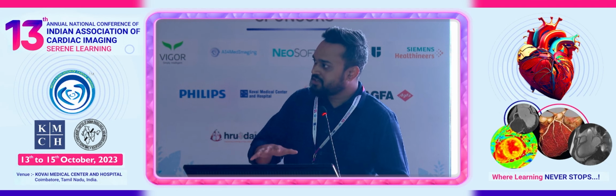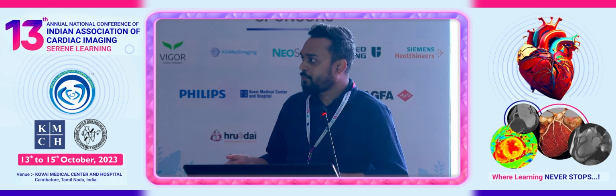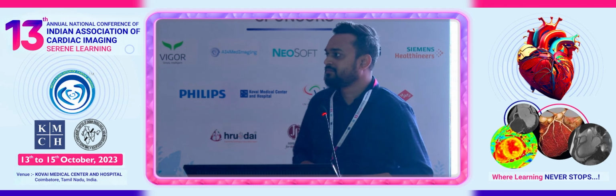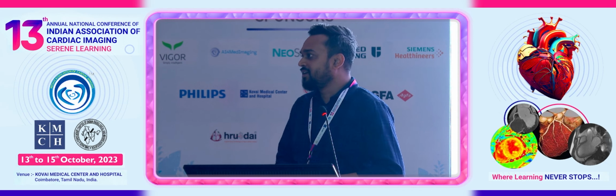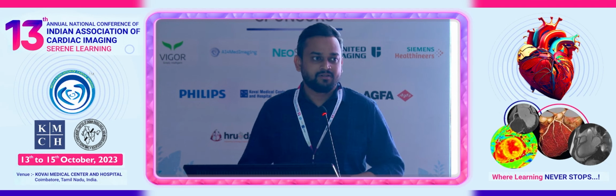No, we did a CT angio. We found it was normal. Then we did a DSA. So did you go back to the data? Yeah, we went back. It was not seen, because these are very peripheral aneurysms, very small, so beyond the spatial resolution of CT.